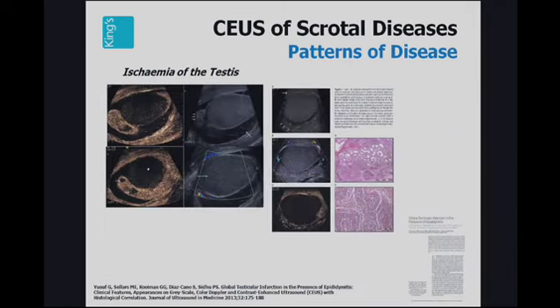However, if you have a problem such as this demonstrated here, where you have very severe epididymo-orchitis, which results in global infarction of the testes, you can use your contrast-enhanced ultrasound to demonstrate the complete absence of vascularity in that testes, and this will influence the operative management. These patients have complete infarction of the testes.